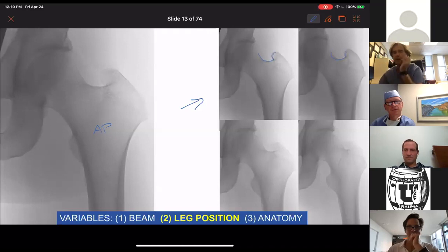So you're seeing the neck en face, if you will, perpendicular to the neck itself. And so you're getting less and less overlap of the greater trochanter on the superior neck. You're also seeing, as you would expect, the lesser trochanter the more internally rotated the proximal femur gets. The shape of the inferior neck stays very similar, though. There's not much of a difference. And overall, the relationship of the tip of the trochanter to the center of the head is similar. Now, as you get further and further away, it changes. We'll see that in some of the external rotation views later.